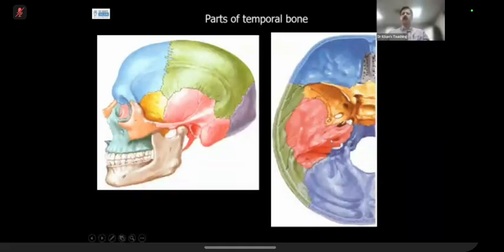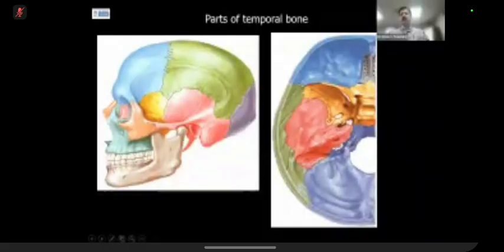But there are so many other things which pass through the petrous temporal bone. We have just covered that the internal carotid artery passes through it, through a canal which we call the carotid canal. And then the facial nerve has to pass into the parotid gland through it. So there is a stylomastoid foramen also. Now, candidate 1, what is this foramen?